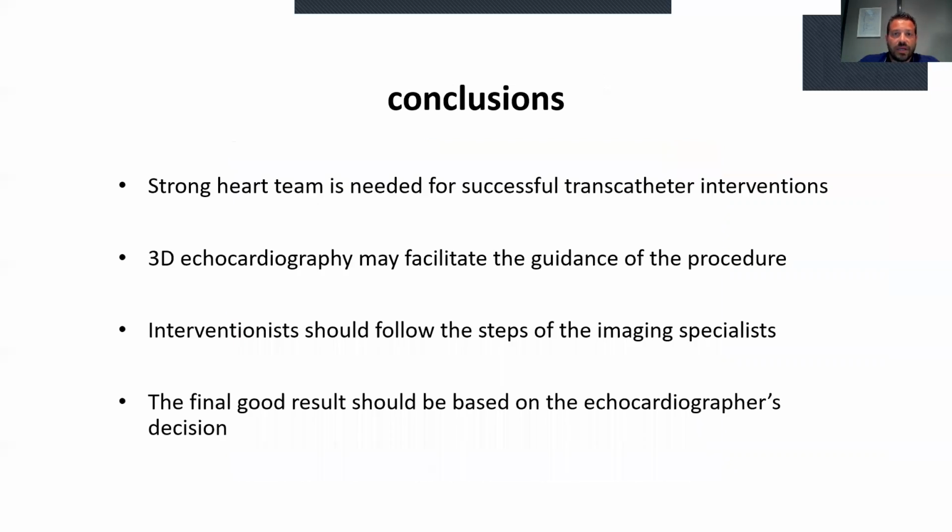So in concluding, you can see that atrial septal defect needs a very nice collaboration between interventionists and echocardiographers. A strong heart team is needed for successful transcatheter interventions. 3D echocardiography may facilitate the guidance of the procedure. Interventionists should follow the steps of the imaging specialists.